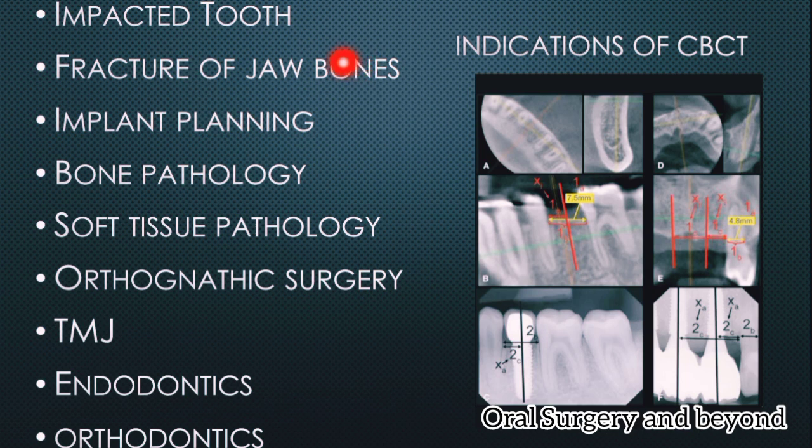So we are able to diagnose whether they are placed more buccally, palatally or lingually, and we can find the exact distance from the vital structures.